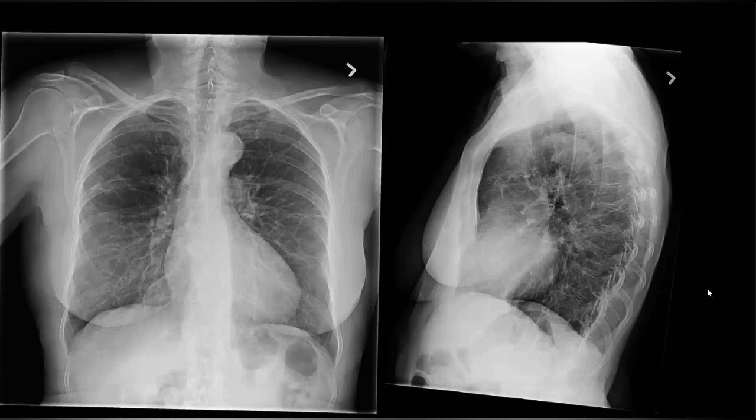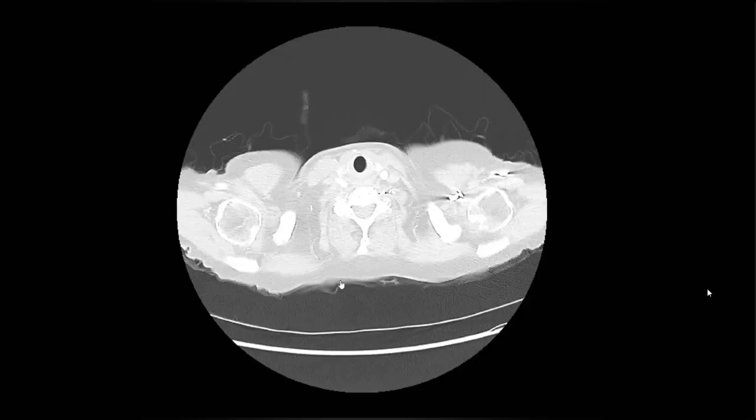The point I'm trying to make over here is that in my humble opinion, that radiograph is not sensitive or specific enough to exclude or include aortic dissection or aortic aneurysms. If you have a very huge anterior mediastinal opacity, that could be a lymphoma as well. It's very non-specific. I'm just making a point because whenever you say something, the examiner would catch it, because you have reached the final diagnosis, and it is a case of lymphangioleiomyomatosis.